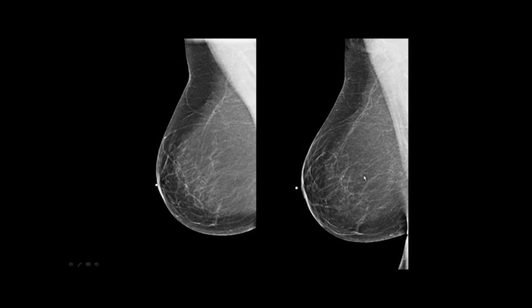All right, let's look at these images. Same patient, different technologist. You can see the different muscle patterns. Well, how'd that happen? It's the same patient. How'd they get different muscle patterns? Well, number one, the technologist possibly put two different angles on here. This could be like 40, this could be 30, or something different, or to the other extreme. It's hard to tell if you're not in the room to see the angle, but they're definitely different angles in the muscle, in the detector, that the technologist used when she was positioning the patient.